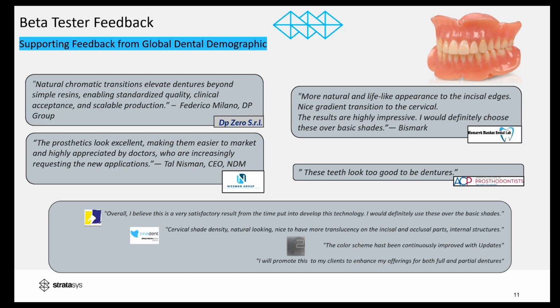The look of these TrueVoxel teeth, I think what Stratasys did with mimicking nature and the different diagrams they used to create these teeth, they did a wonderful job. They put a lot of time and effort into it to get something where we are now taking our basic or standard dentures, and with just a click of a button, getting a highly aesthetic premium denture. And we know that the aesthetics are there. We know that nothing is going to change with the strength of the denture with this update, because it's a software update. It's not a physical material update, which makes everything very simplified.